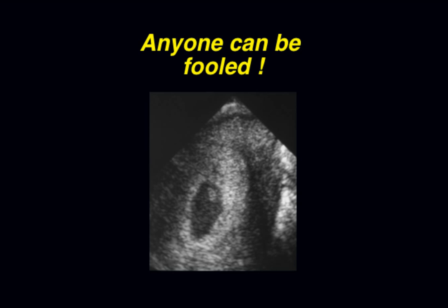Finally, I will state that pseudogestation sacs can fool even highly experienced diagnosticians. Dr. Peter Callan, the author of the book on obstetrics and gynecology sonography, bet me $1 that this structure was an intrauterine pregnancy, but that the embryo had no heartbeat. I bet that it was a pseudogestation sac of ectopic pregnancy. In the second lecture, I will explain how I won the bet.